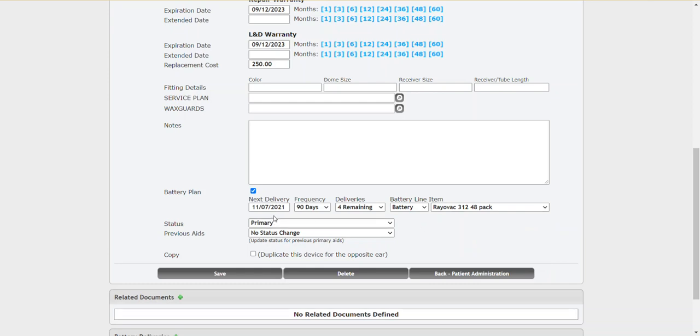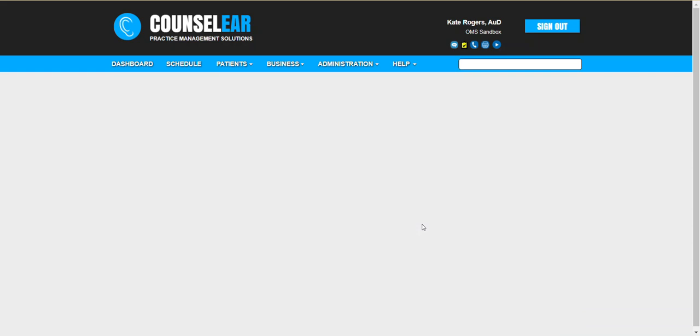All right, so we're saying next delivery is on November 7th. Every 90 days, we'll be sending these to patients or having them pick them up. 4 remaining, and here what needs to be delivered. Okay. So we're going to go ahead and click Save. That will lock it in for this device.